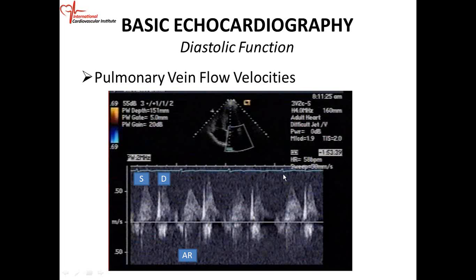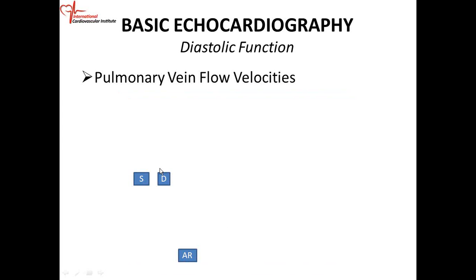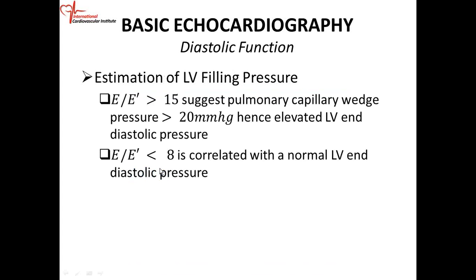Your ECG is on top, okay? So you get a systolic component, a diastolic component, and an atrial reversal.